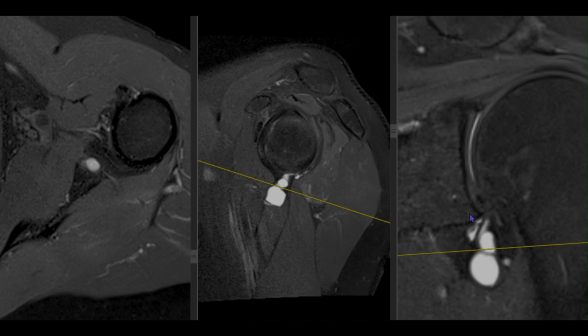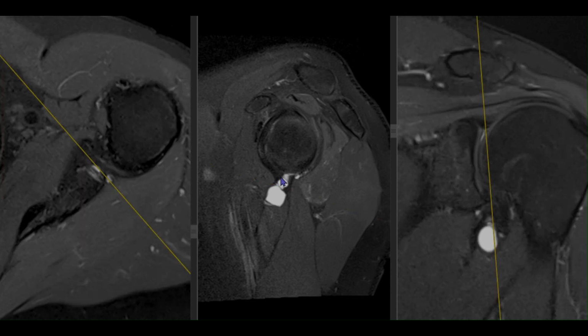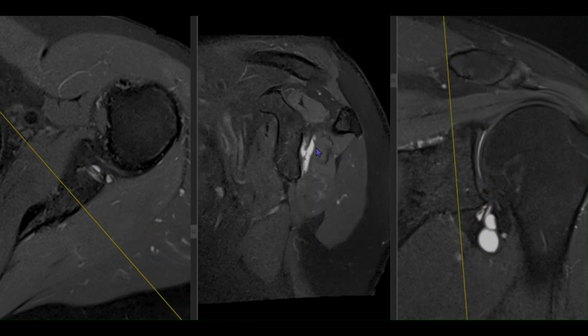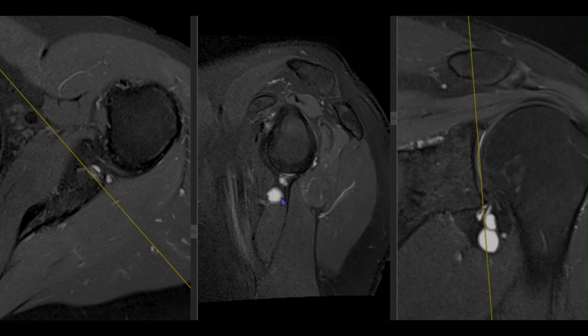Again this is nicely depicted on the coronal images. On both sagittal and coronal images we are able to see this paralabral cyst better, and we see that there is some connection between the cyst which is extending in the spinoglenoid notch and the cyst which is extending up to the quadrangular space. In both these spaces we have neurovascular bundles traversing, and this is a potential site where the nerves get irritated or impinged upon because of the paralabral cyst.